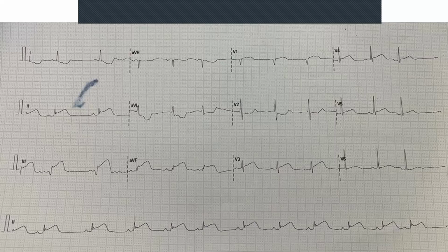Right? So every time you breathe in and out, your heart goes slightly faster and slower. Your heartbeat is not supposed to be exactly the same throughout. That's also an issue if you don't have it, because that means you're not breathing. Okay, so you have to have that.